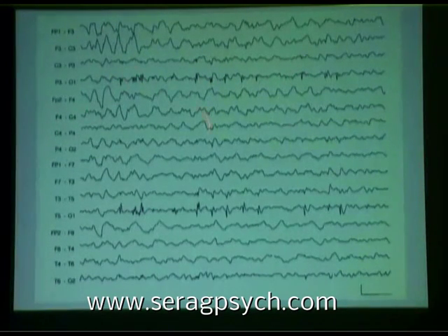This is a sleep recording with all this delta and V waves and things. But notice these spikes here. And notice that there are multiple spikes or polyspikes here. And they're really not artifact, because you can see them just a little bit there up at P3 from O1. And you can see them even better at T5. Here they are at T5 going down to O1. O1 is very negative here, but you can see they do spread a little bit up to T5, as I said before, for the other ones. But notice how they look sometimes like muscle potentials or artifact, and notice how abundant they are once you realize what they are. Next, please.